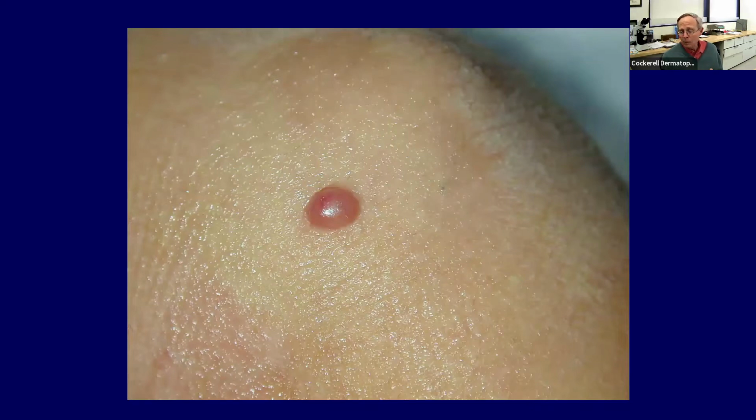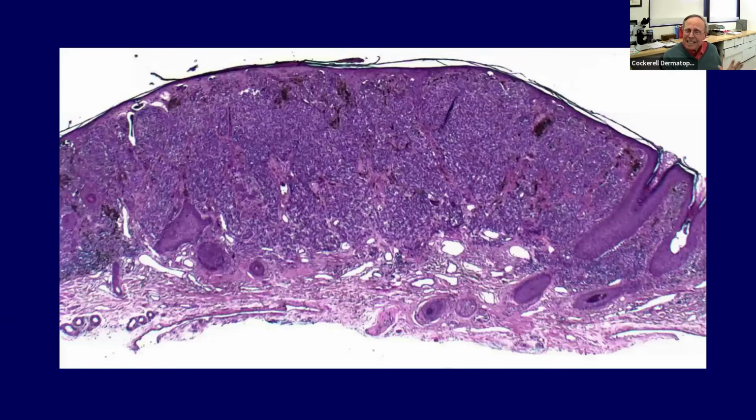But this is a classic example of Spitz's nevus. And when all of these features are present, you really don't need to hedge the diagnosis and call it an atypical spitzoid lesion, only when it's got some funny features.